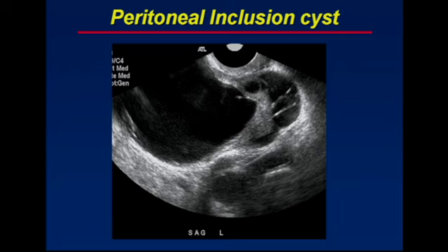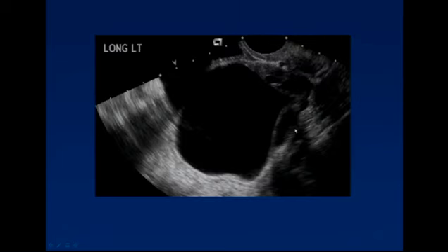So what are we looking for? Well, peritoneal inclusion cysts typically have angular margins, especially as they abut what looks like solid tissue. Then if you look more carefully at the solid tissue, look for the presence of follicles, as we see here, and the presence of strands that come off from the tissue at right angles, the spider webbing of the peritoneal inclusion cyst.